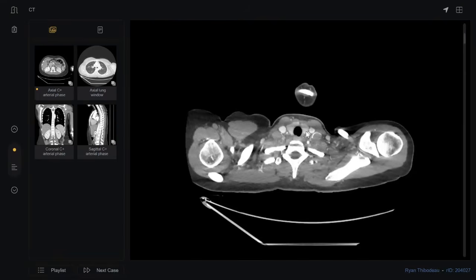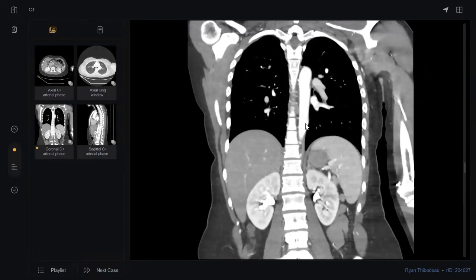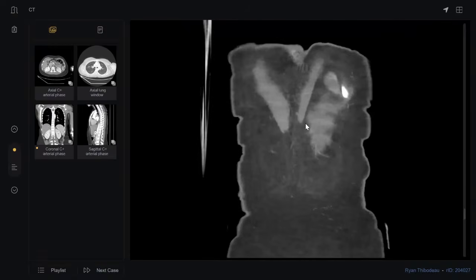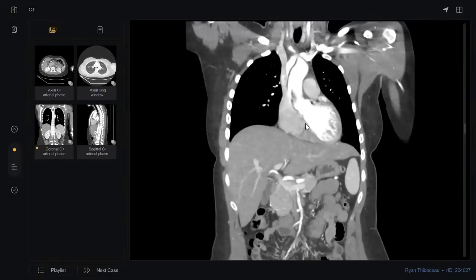If we do MRI, you will see the wall very thick. And this is the value of MRI with contrast. Not just showing you the lumen, whether it is narrow or dilated, it can also show the wall itself, how extensively it is affected.